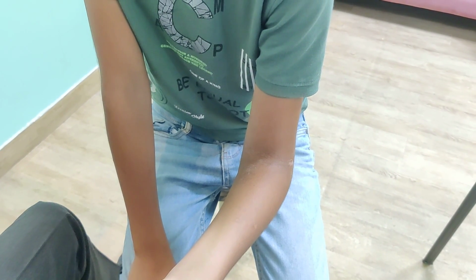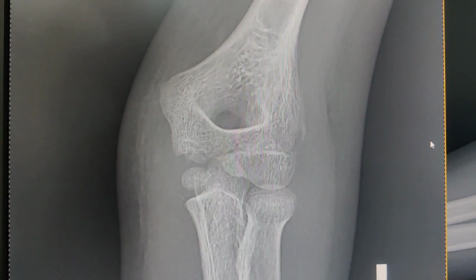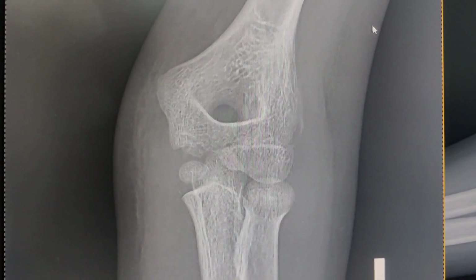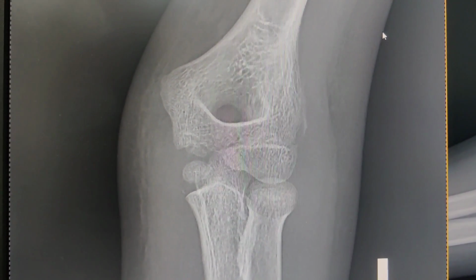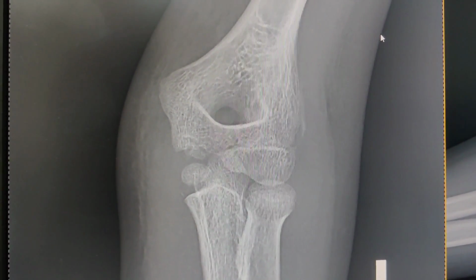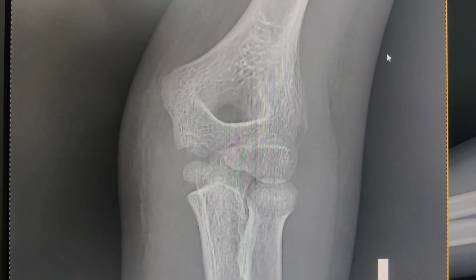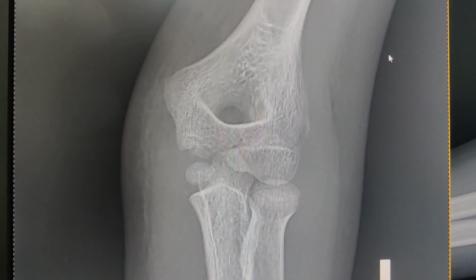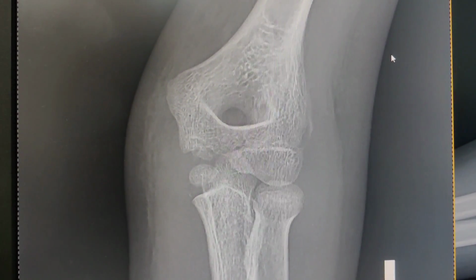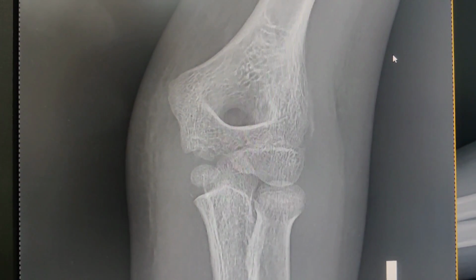So we have x-rayed his elbow, and I am going to show you what it shows. This is this boy's AP x-ray. Now if you look at the AP x-ray, I give you a few seconds to see what you see and see if you can spot any abnormality, and I would like you to be able to make this diagnosis, or suspect at least, by purely looking at the AP. In the lateral it becomes obvious, but only if you are suspicious about this injury. If you don't suspect, then it will be very difficult to diagnose. As somebody has said, what the mind doesn't know, the eyes can never see.